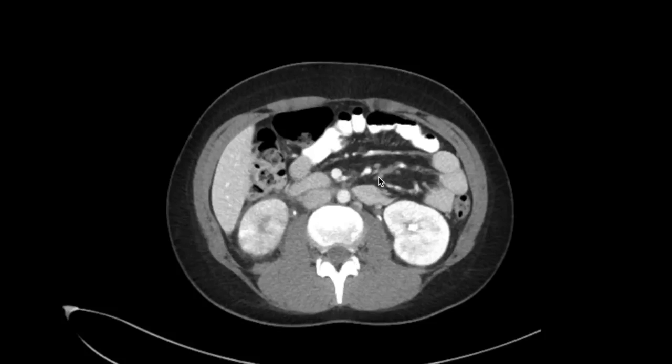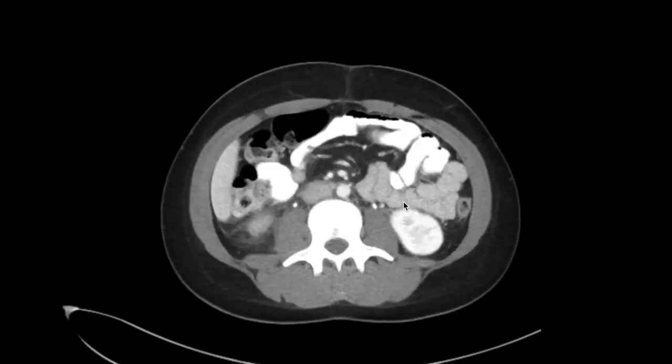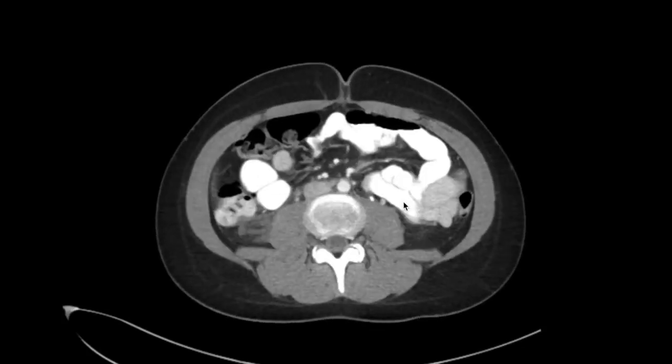If we thought the lymph node was abnormal and measured it, you have to remember that size is not everything. There are different size cutoffs for various stationed lymph nodes, but in general, if you remember, around 1 centimeter is a cutoff, you'll probably be pretty safe. But again, size is just one part of the picture. Things like rounded lymph nodes, heterogeneous or cystic change, those things can strongly suggest that the lymph nodes are abnormal, even if they're much smaller than a centimeter.